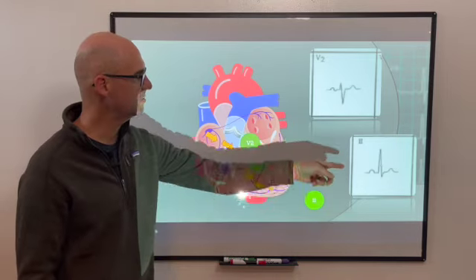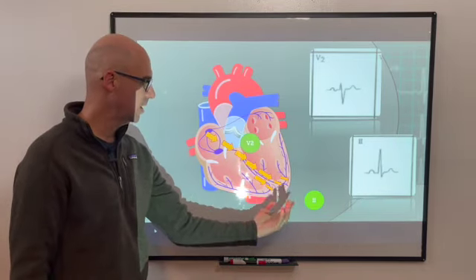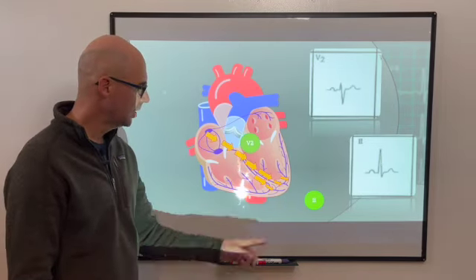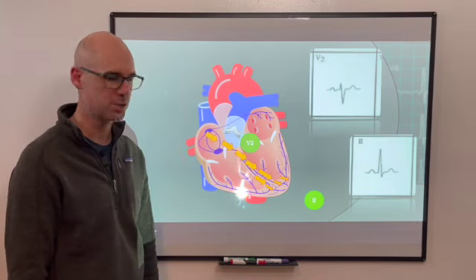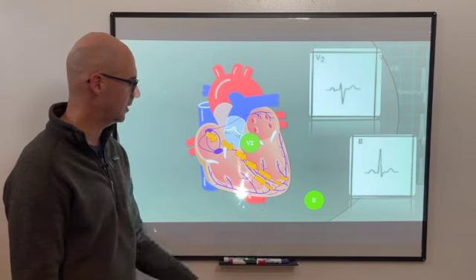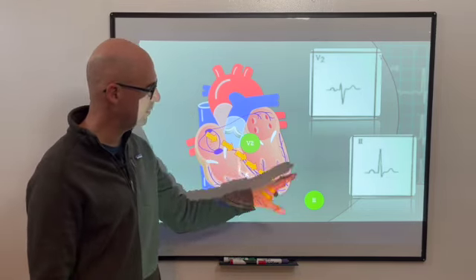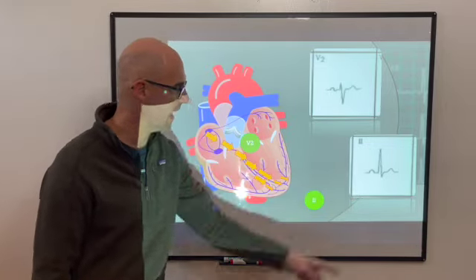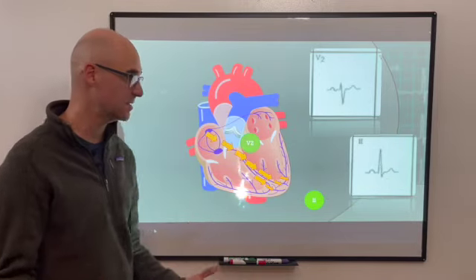Well, lead 2 is very different than lead V2. Lead 2 is sitting down here, kind of looking upwards at the bottom part of the heart, specifically kind of looking almost directly at how depolarization follows under normal conduction, all right? Looking at that left ventricle down here. And so as depolarization happens, it's almost all primarily moving toward that camera where lead 2 sits. And we see that because primarily the entire complex is positive, right?